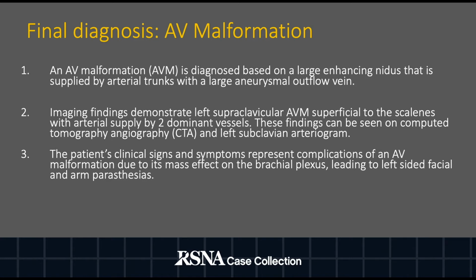Our final diagnosis is AV malformation for the following reasons. An AVM is diagnosed based on a large enhancing nidus that is supplied by arterial trunks with a large aneurysmal outflow vein. Imaging findings demonstrate left supraclavicular AVM superficial to the scalenes with arterial supply by 2 dominant vessels.